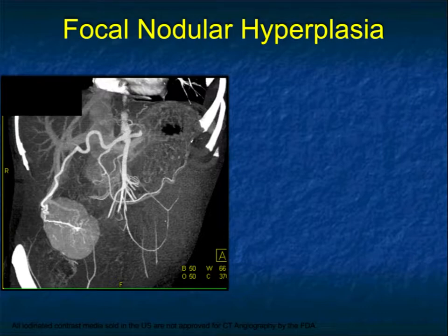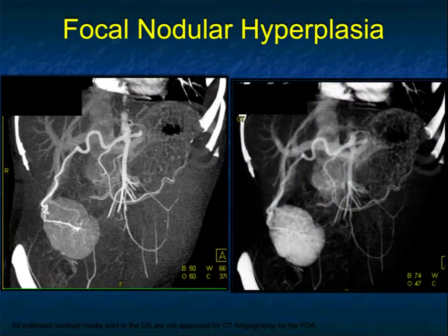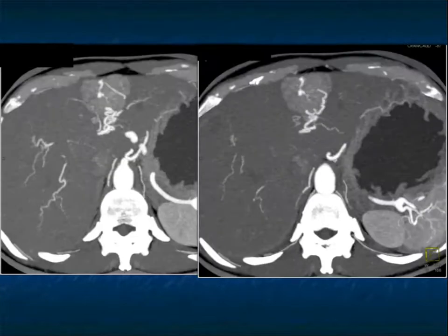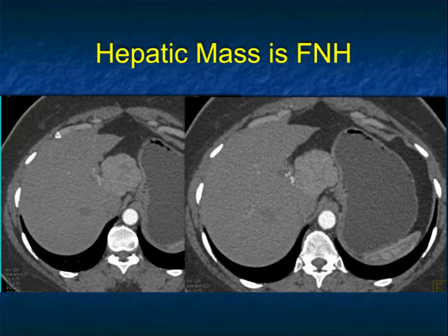And just to show you, I showed you examples of how they simulated gastric GIST tumors. Here's one that presented as an appendicitis with a large mass in the right lower quadrant coming off the right lobe of the liver with that prominent vascularity and the feeding vessel. And here's an example of a couple of FNHs, one with a central scar, one with a prominent feeding vessel. Just a really nice example of some of the classic appearances of FNH.